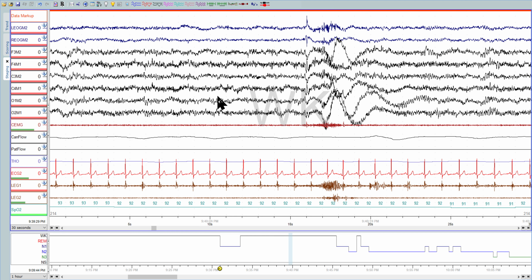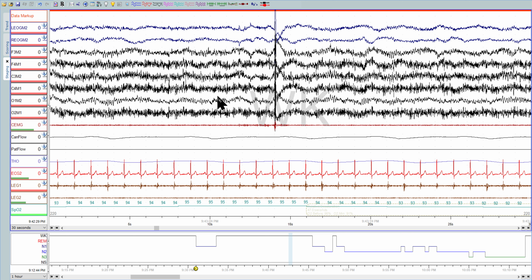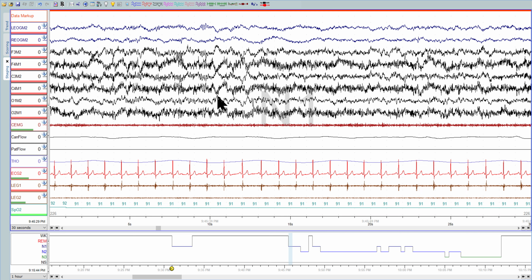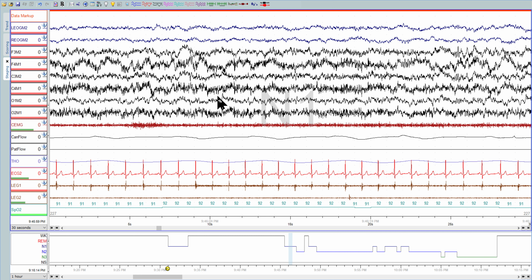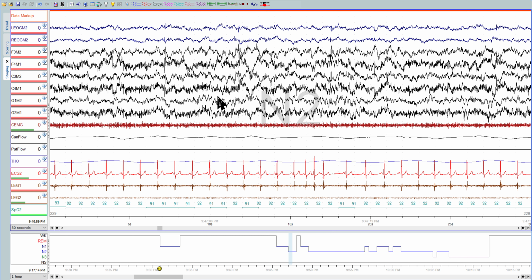And it cruises right along here. Just plow right through this little section. And looks like you perfectly marked stage 1 here. And then 1 here as well. 1 here as well. And I think this is still 1 actually.